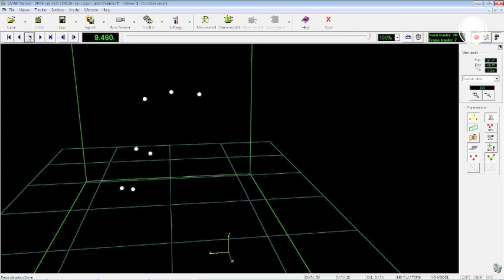on the scene. The difference between an anatomic model and a technical model is that the first one, as I told you, requires the marker to be on bones protrusion, skeletal protrusion of the subject, so points that are referenced in the anthropometric field. For the technical model, also called technical protocol, we can place clusters of markers, at least 3 markers, for each segment that we want to be focused on. So basically we create the reference system for each segment, so we are not looking at the anatomical point.